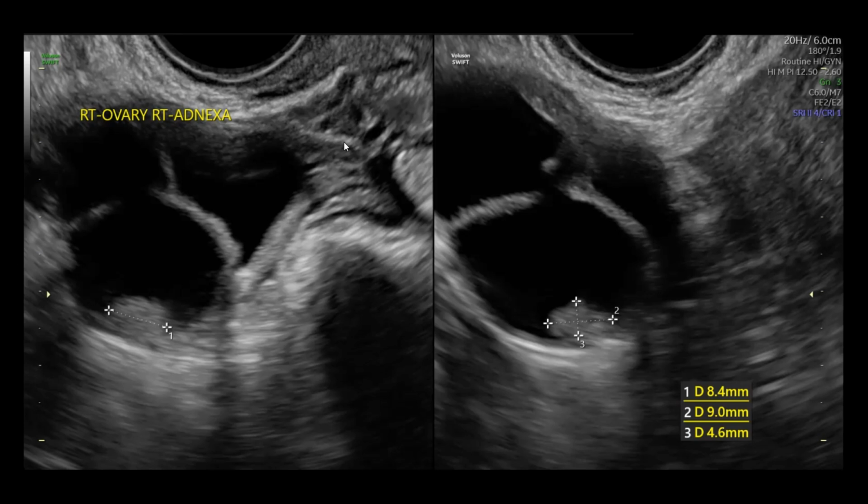However, unlike the original ADNEX calculator, which you can use without a CA125 blood test, the Evidencio model you must use with a CA125. And in the world of imaging, we don't always get all that information, or it's happening after the scan is done. So I did know in this case that the CA125 was a normal level, actually. But despite that, our ADNEX model calculated this at risk of a borderline malignancy of around 12%. The overall malignancy category was just slightly greater than that, but the majority of the calculation centered in on borderline ovarian malignancy.